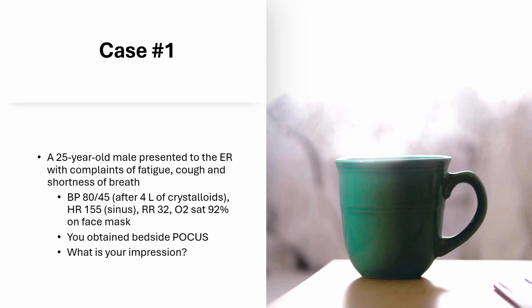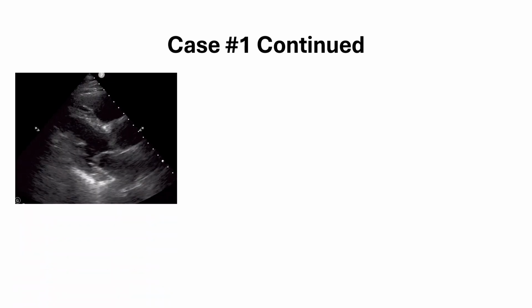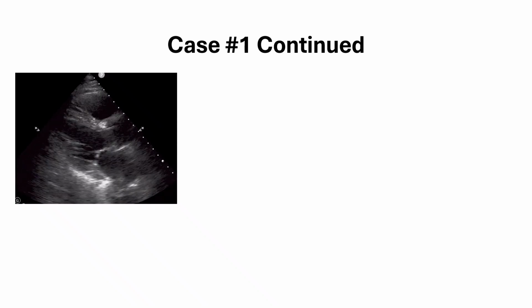You obtained a bedside point-of-care ultrasound. You used the RUSH exam for that. And the next question is, what is your impression? We'll follow on to the next slide. So let's look at some of the ultrasound images you obtained for this patient. Here is the parasternal long axis view. Again, take a moment and pause the video if you want to understand what's going on.